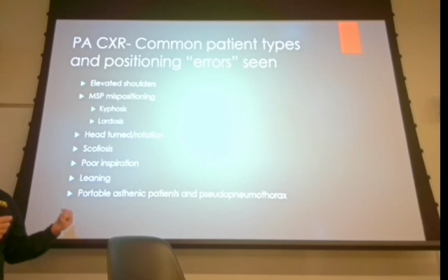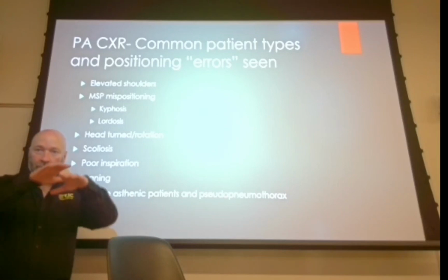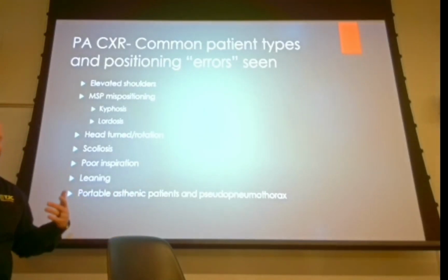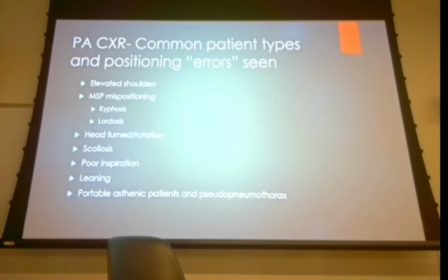With the other things to consider, it's probably one of the least important things to really stress about. Again, if you have a patient whose shoulders just look flat, then they're holding their shoulders up, so try to talk them into relaxing their shoulders.